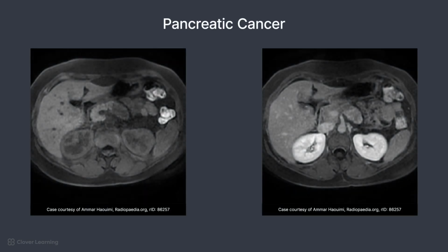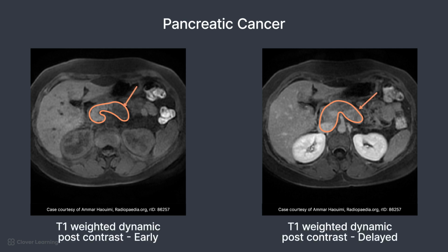Pancreatic cancer is a malignant ductal tumor, often in the pancreatic head. On MRI, it's T2 hypointense, sometimes causing ductal obstruction depending on the tumor location. T1 weighted post-contrast enhancement is slower compared to normal pancreas. Therefore, a dynamic injection technique may be requested from the radiologist.